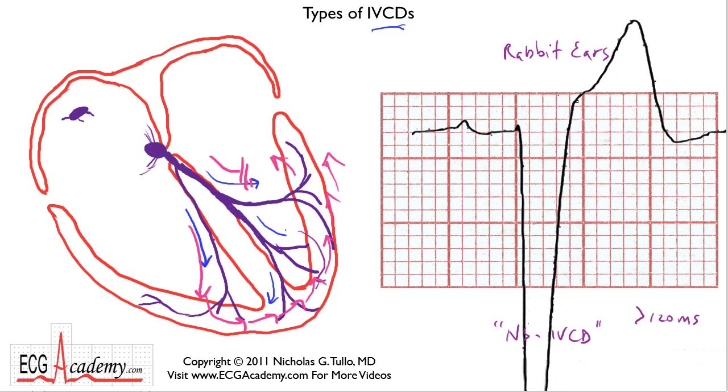Here you can see the QRS duration is 170 milliseconds or so, and the slope of the electrical signal, often the downslope, is very slurred, and that's just a reflection that it's taking a long time to get around the left ventricle. So this widening and this characteristic deep S wave, or sometimes there's no R here, sometimes it's a QS pattern, is pretty characteristic of a left bundle branch block. Now there are a couple of other things that can disturb the electrical signal's ability to get around the heart in a rapid way.